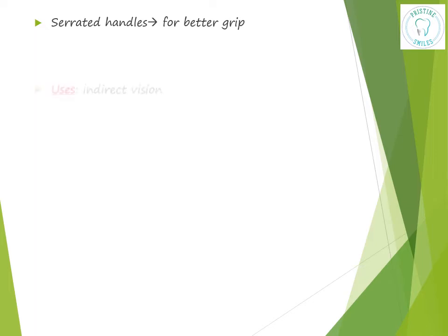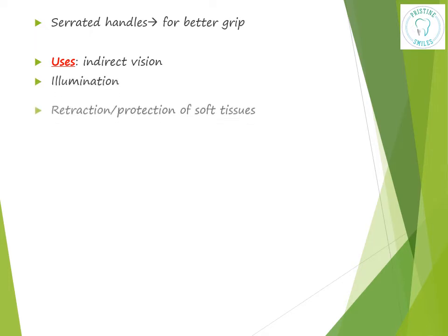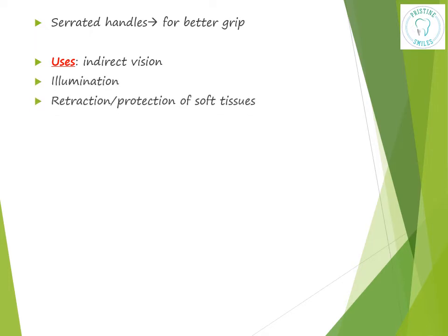A mirror is used for indirect vision, illumination, retraction or protection of the soft tissues, percussion of teeth, and also for checking tooth mobility.